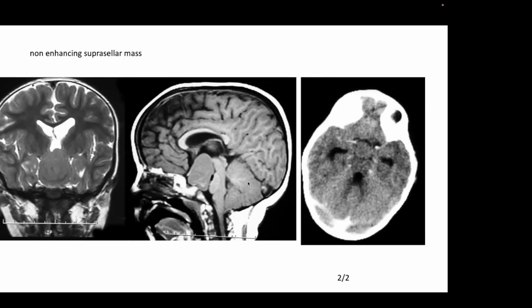But again, these tumors do not calcify. They look just like brain. In my experience, they never enhance. So this is hypothalamic hamartoma.